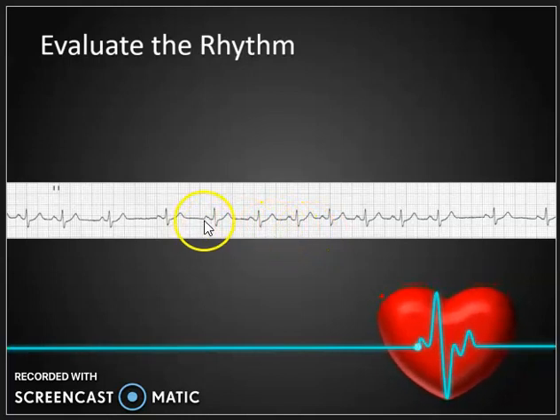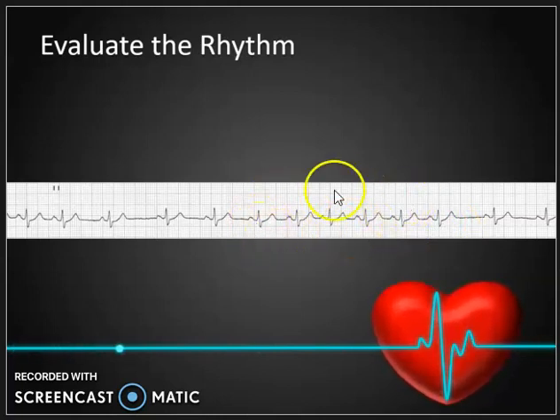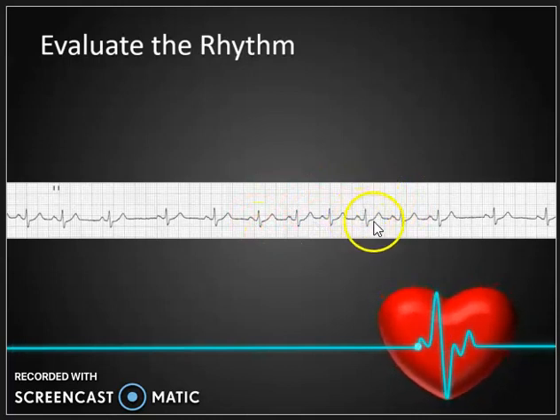And then the PR interval, if you look here, is also normal before every QRS. Our QRSs all look to be a normal morphology. T waves are normal after every QRS, no ectopic beats. This one can be a little bit confusing, but it is a sinus arrhythmia. Why? Because we've got P waves, QRS, T waves, normal rate. That's why it is a sinus arrhythmia.